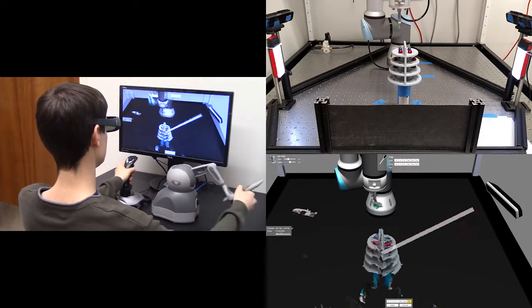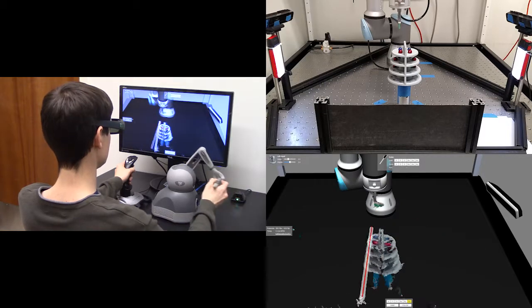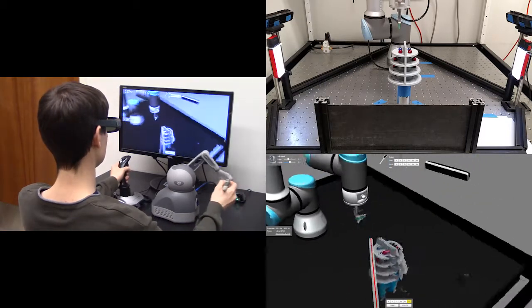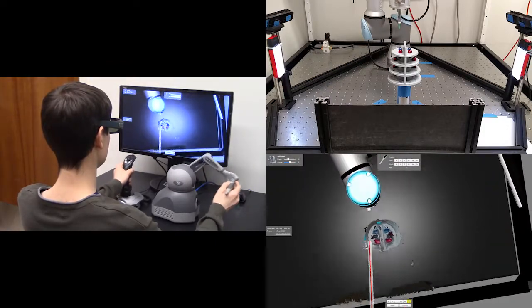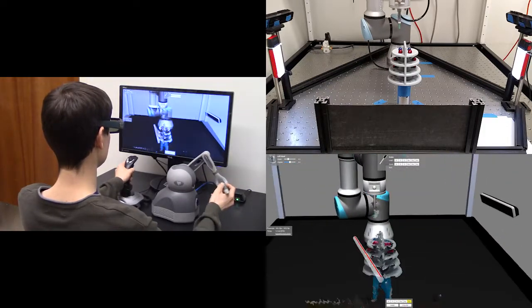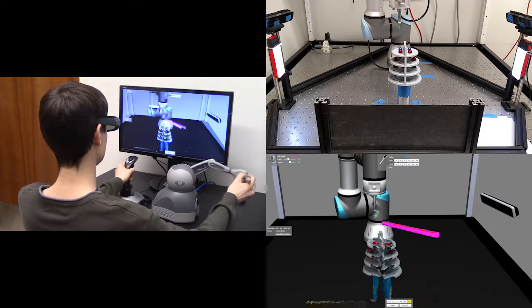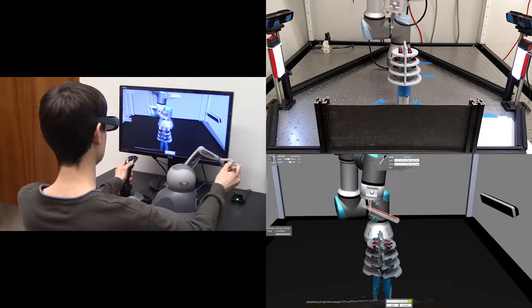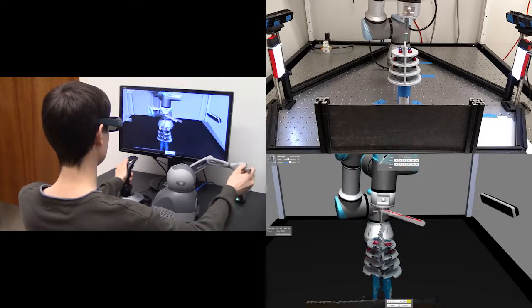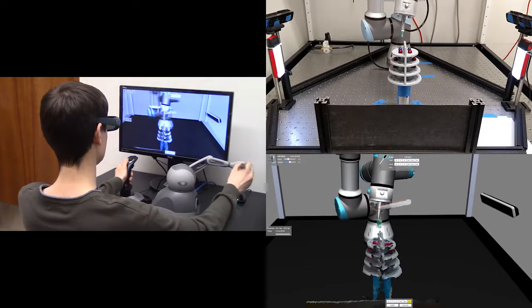The operator's hand motions, as captured by the haptic stylus, are mapped to the wand in the user's view. Note that as the user rotates their view, the wand moves with the user, preserving directions of motion. When ready, the user can grab the tool at any point along its shaft using the wand. The user's hand motions are now mapped onto the surgical tool, which the robot executes.